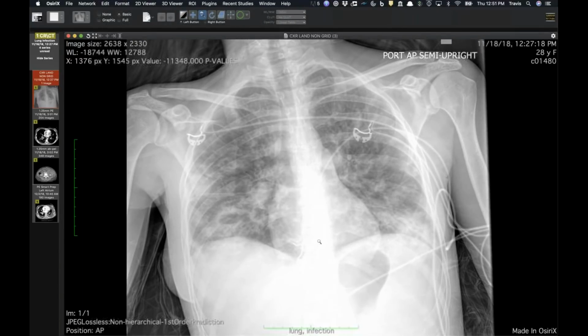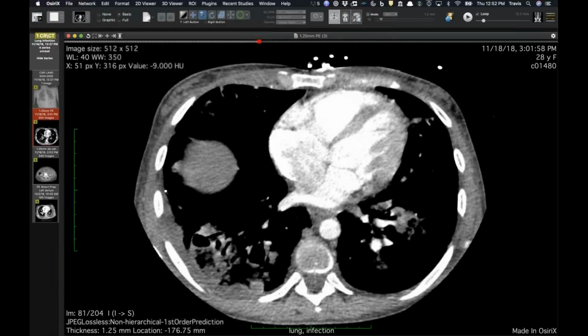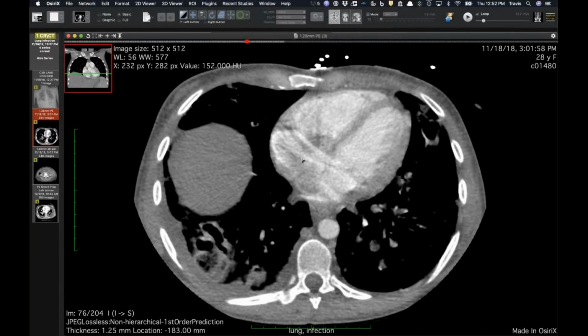this one. It is not a diagnostic dilemma, but it's a nice example of this, and it's nice to show some just classic stuff too. This is a young woman who back in November presented with fever and bacteremia, and you can see multiple areas of consolidation. And of course, when you see bilateral and you hear bacteremia, you start looking for cavities and cavitary consolidation. She is a drug user, and this did turn out to be staph from intravenous drug use with septic emboli.